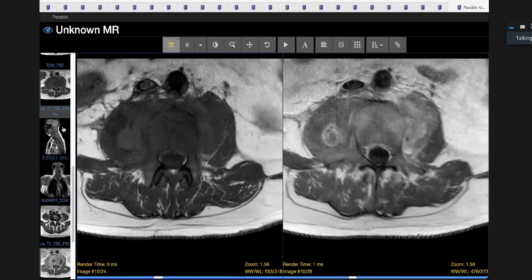Phlegmon left and abscess right. That's right. Sorry, I might have got the left and right mixed up, as someone just said in the chat. So that's right. Abscess is on the right. Okay, so this is discitis. This is bacterial, this one. But they might ask you about TB.